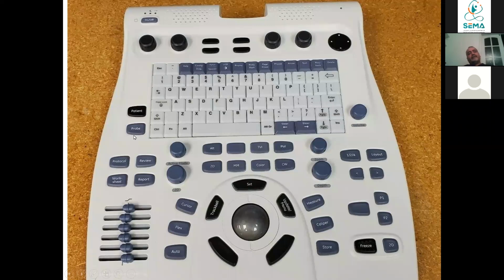And usually the probe for cardiology is straight, whereas the cranial ultrasound probe is moon-shaped, concave for the cranium. Anyway, it can also be used; the 12 probe can be used even for cranial ultrasound.